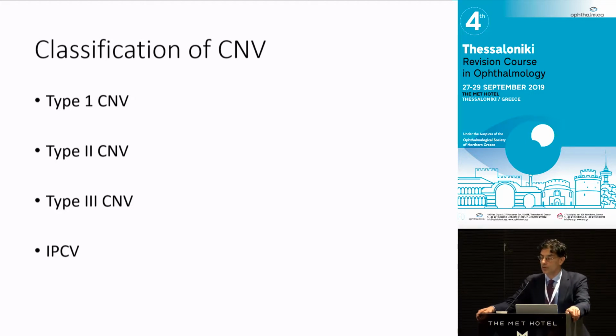And when you get choroidal neovascularization, it's got different classification systems. And this is the one now in the OCT era we most use. And this classification is an expansion of a classification used to help us understand why 20 years ago different types of surgery to remove choroidal neovascular membranes had different outcomes.